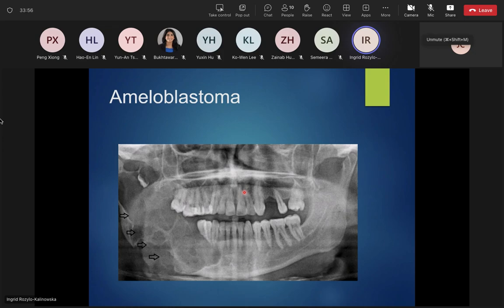And against the radiolucent background, you can observe a lot of septa inside the tumor. So in fact, what's most important for you as a future doctor is to be able to find out that there is some kind of lesion, and then decide whether it is malignant or looks benign, and when to refer your patient for consultation and for further treatment.